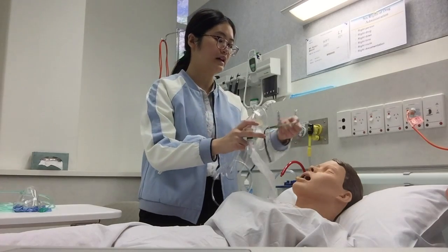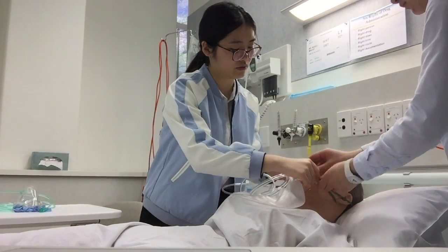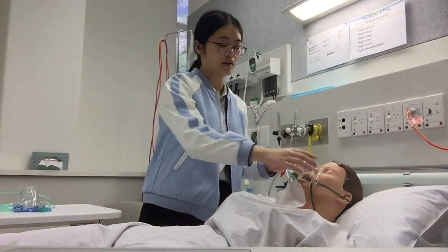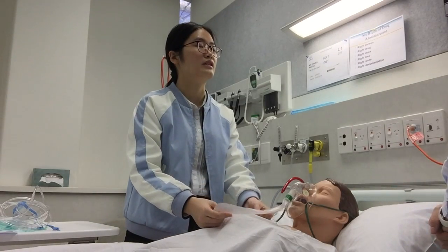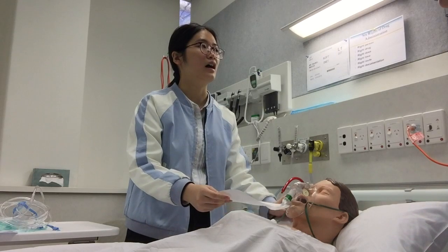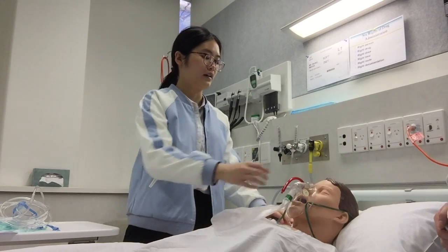If we connect with the patient, make it secure, and connect with oxygen, and you find that oxygen delivery is insufficient, which means the bag is deflating, then you need to take action, like give another mask to the patient or check what's wrong with the bag.